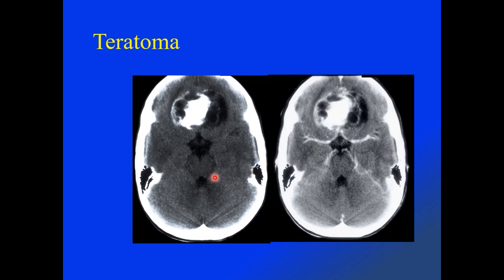Two CT images demonstrating a midline anterior inferior frontal mass, which appears to be bihemispheric, with areas of discrete low density similar to that of fat, areas of prominent hyperdensity on this non-contrast image consistent with calcification, and the post-contrast axial CT images demonstrating some areas of solid enhancement in this patient with a CNS teratoma.